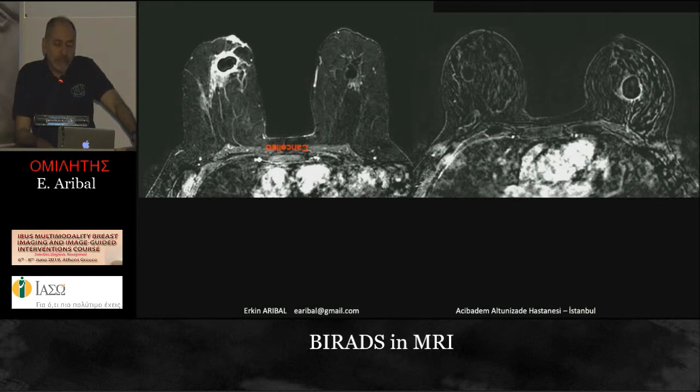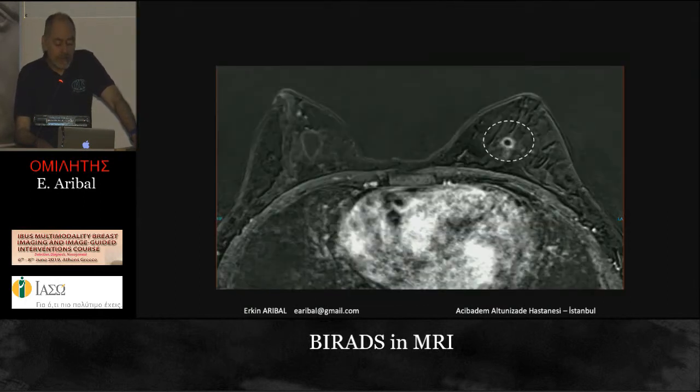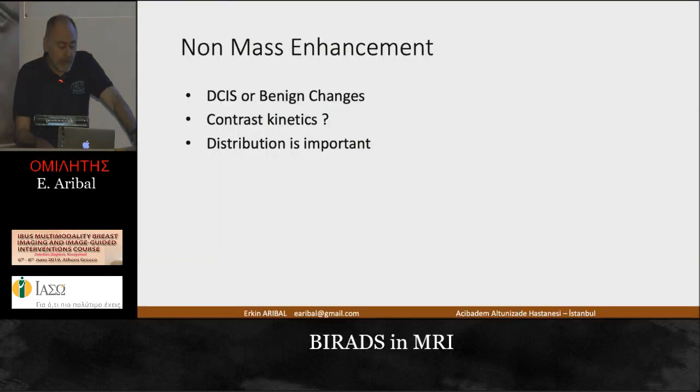But here it's a very large tumor which looks like an irregular rim enhancement, but when you look inside the enhancement, it is very regular. It is the contrast enhancement around the cyst, which is an inflamed or complicated cyst. So it is called the eclipse sign. This is another case where, when you look inside, it is quite regular. So it's again a complicated cyst.